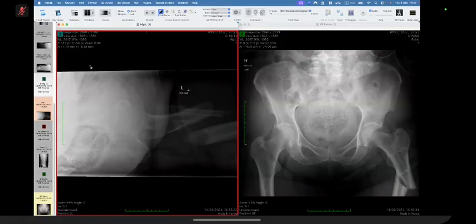I'm unable to clearly visualize the lower end of the sacrum and coccyx. I think the sacrum and coccyx are fine. Tell me what you think of the fracture. There are no other findings. Don't worry about osteoarthritis and everything. What do you think of the fracture?